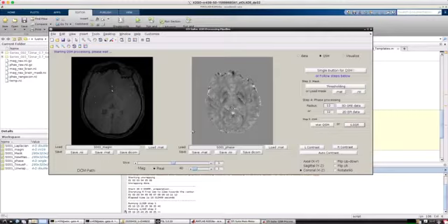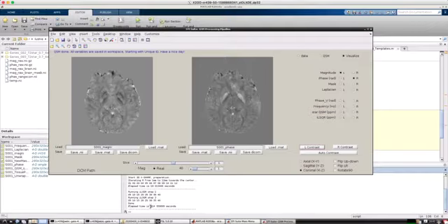Okay, so now it's nearly done. You see that it has started on step 2 and then sort of reached its last iteration. It says done, took 214 seconds, and now we were sent to the visualize tab. In the visualize tab you have two images, left and right.